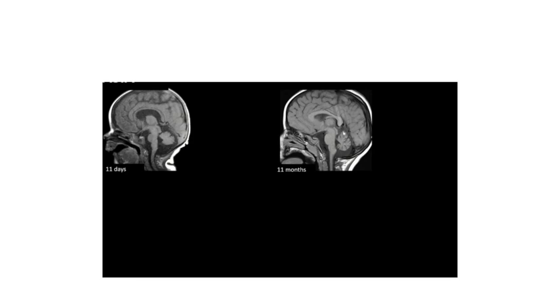Whereas in this case, the cerebellum is really well formed, but for 11 months of age, you can see the folia are quite separated, the fissure is widened. So this is what we would call an atrophy.